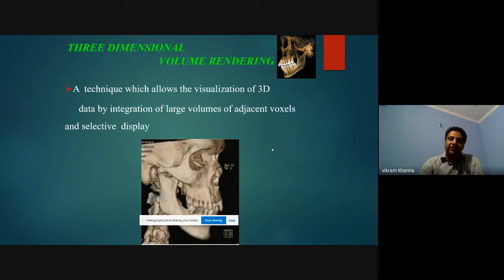After stacking, this is the 3D volume which you can see after getting all the volume. This is how a 3D picture looks when initially volume rendered. But what I suggest is that 3D pictures are not reliable for diagnosis of pathologies. Always use all the sections, because they are clearer and give more information.